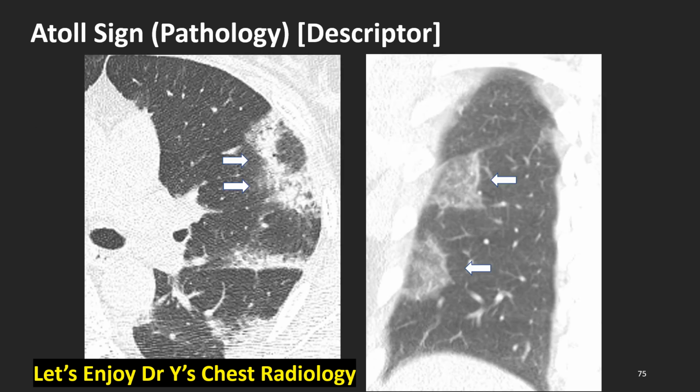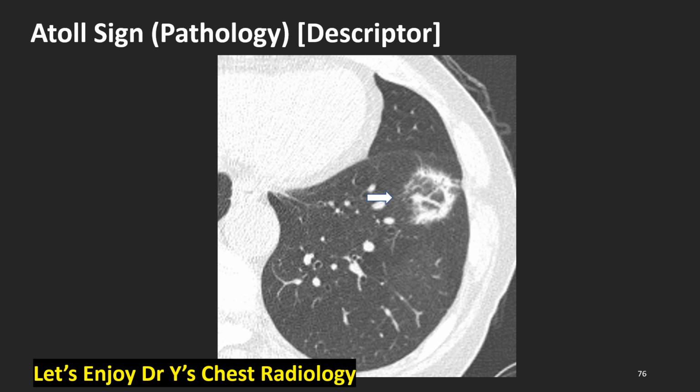Atoll sign, pathology descriptor. Arrows indicate atoll sign in axial and coronal CT scan. Arrow indicates atoll sign in organizing pneumonia.